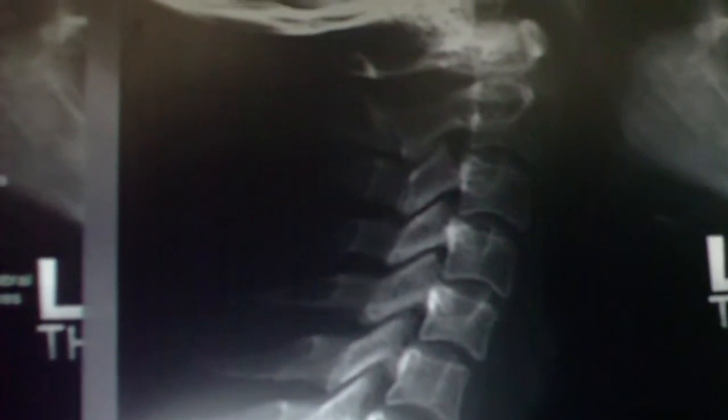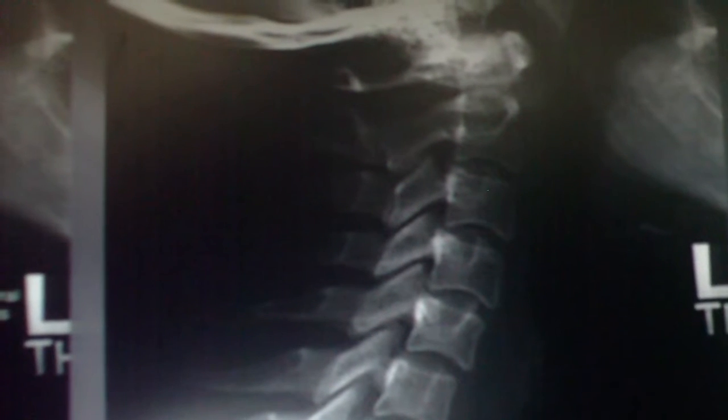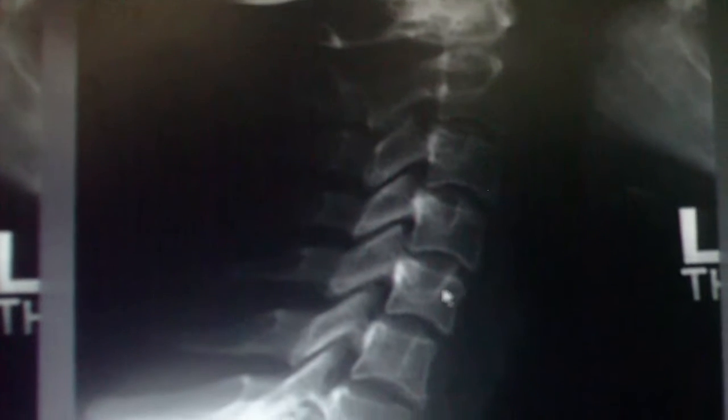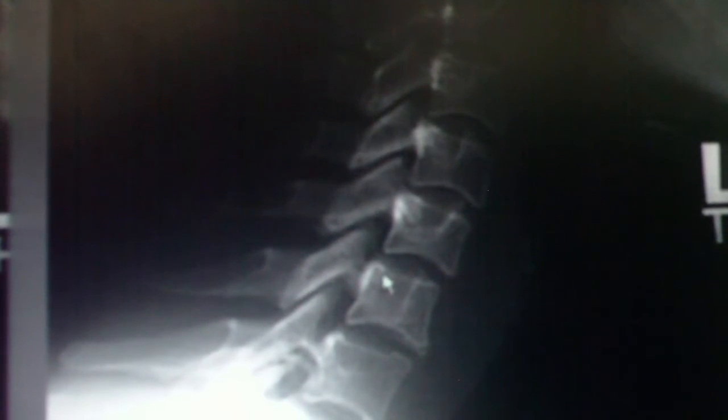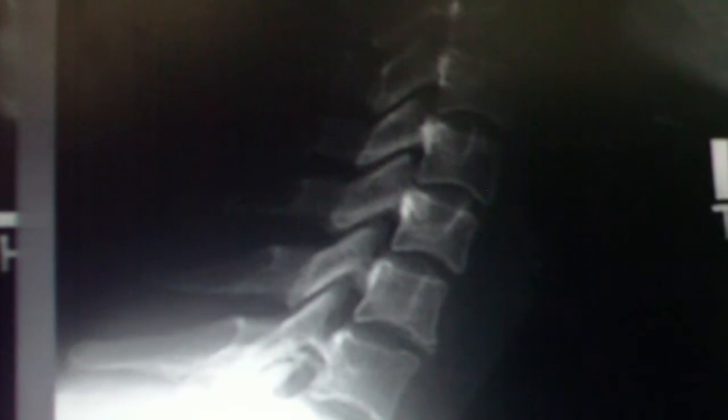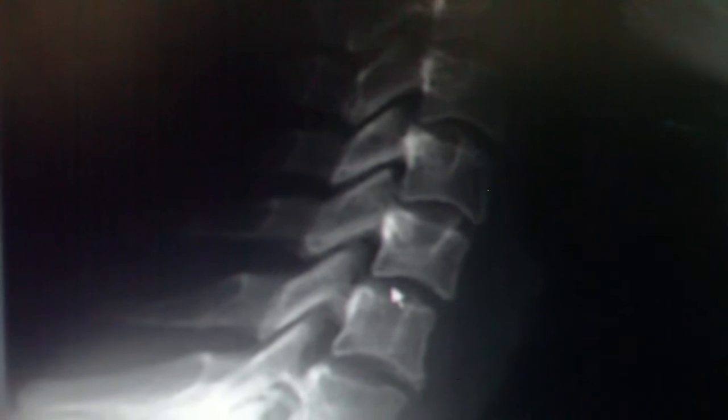Generally, as you can see here, it's on the inferior end plate, not so much so on the superior end plate. Those are generally flatter. Remember, you've got an uncinate process, and that's what's adding the density to these disc spaces, and they occupy the posterior two-thirds of the sides of the end plate, or the sides of the vertebral body, right? Kind of like ear flaps pointing up or something, right? So maybe for that reason you don't get true lateral protrusion or extrusion of nuclear material, but rather posterior and lateral.